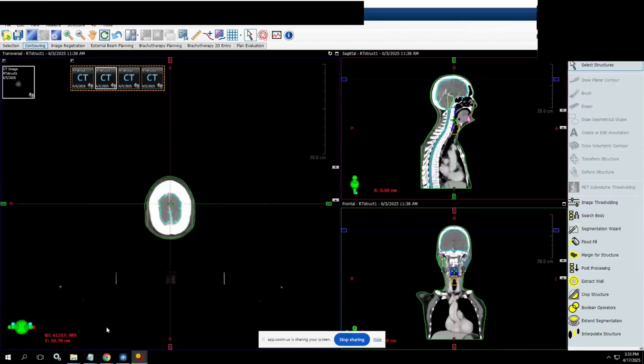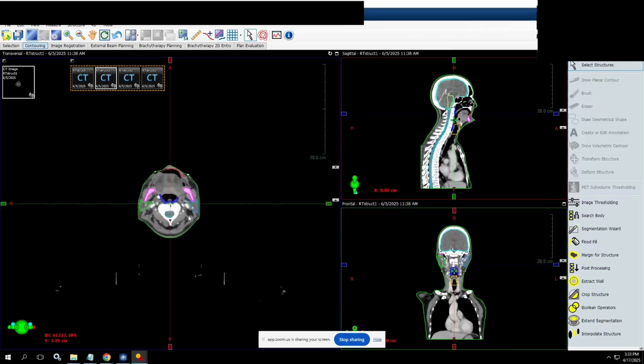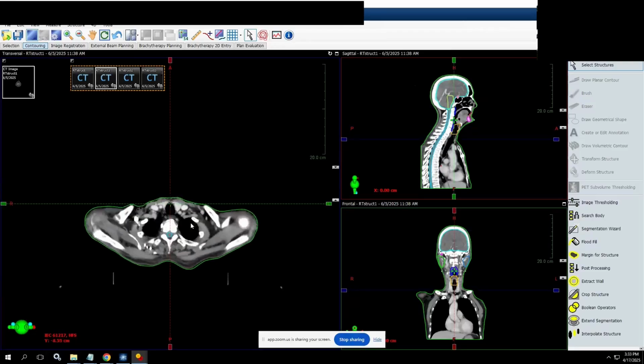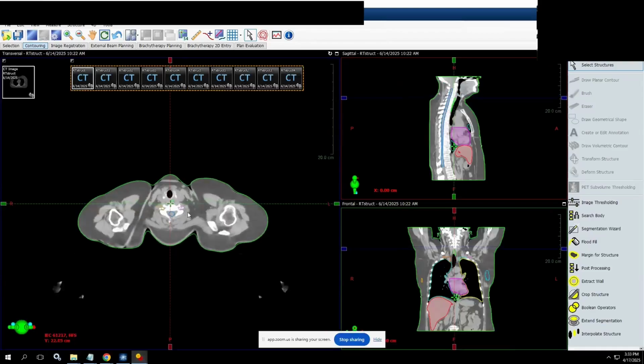In the next case we will see the performance of the model in a thinner patient. Now this patient we have selected particularly because the body mass index is quite low, and this has been a problem when we evaluated segmentation solutions generated from the West, where models were trained on more obese patients. And we can see that because our training dataset was representative of the Indian population, we got a reasonable model performance even for this patient. In fact, all the structures have been drawn.